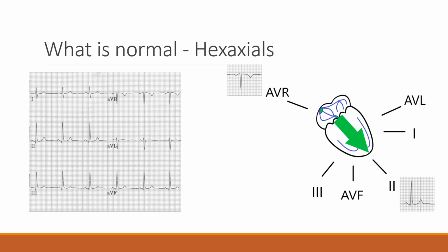And so when you look here at this chart, you can see I've got a norm on the left side. We've got half of an EKG, so it's the 6 hexaxial leads, and this is just kind of a normal progression. So there's a normal sinus rhythm with the electrical flow that's going in a normal direction. So when I map that out, lead aVF, lead 1, lead 3, a lot of those leads have some variance in what they're supposed to look like, but aVR and lead 2 especially have a pretty predictable pattern in a normal EKG. Everything is moving away from aVR.